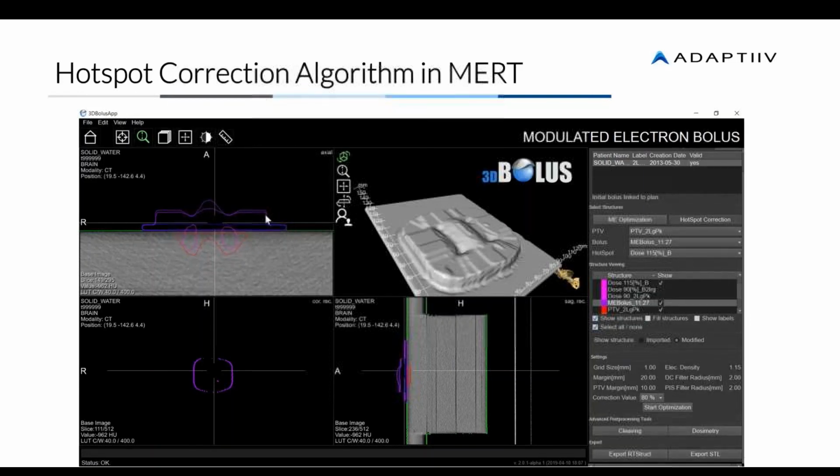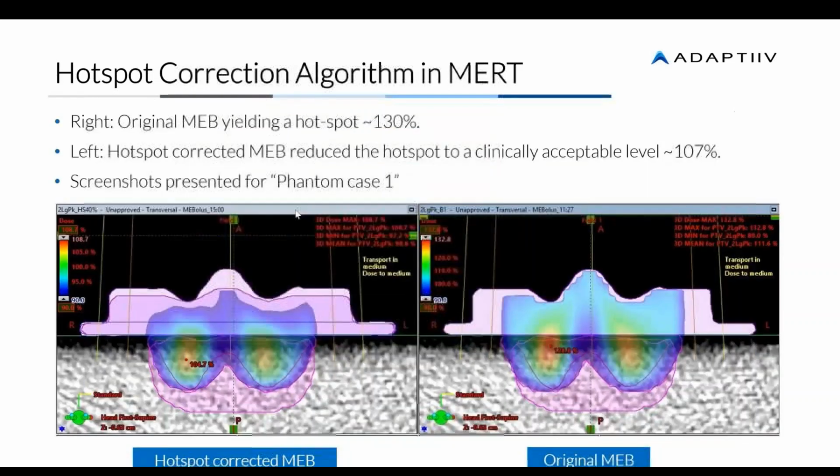And as you see here, the optimization is a ray tracing optimization that further modulates the shape of the already modulated surface of the bolus by scaling or reducing the peaks, or basically scaling the peak to valley ratio to a different user selectable value. So when we go back to the TPS, this is what we get.